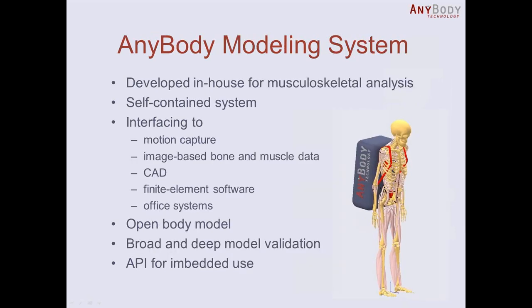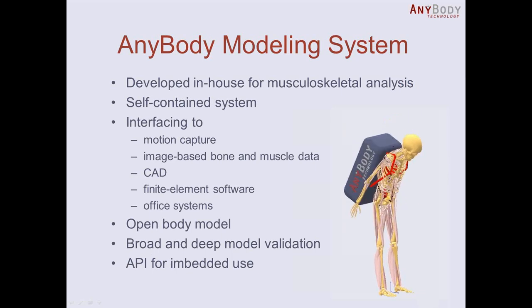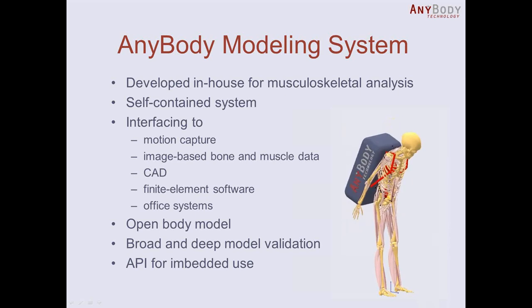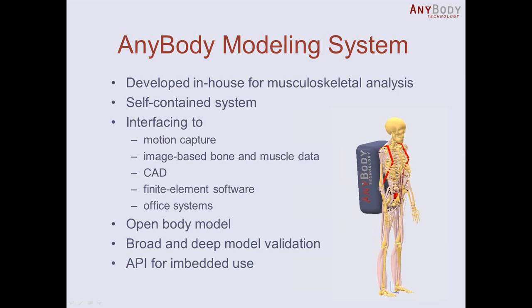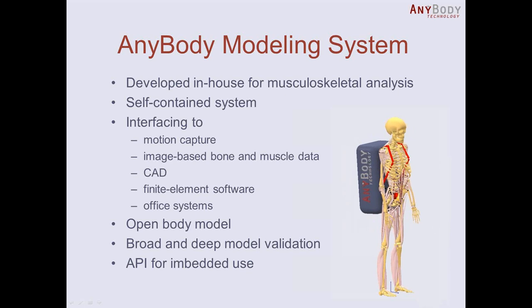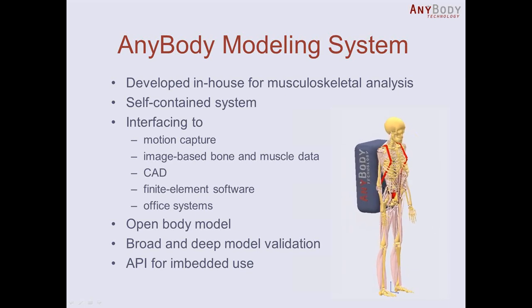So AnyBody is a multi-body system made for musculoskeletal modeling. It's a self-contained system. That means it does not need any third-party software except from Windows. It has several interfaces, so you can read in motion and external forces from motion capture systems.